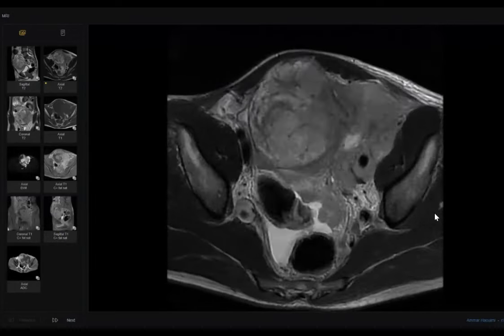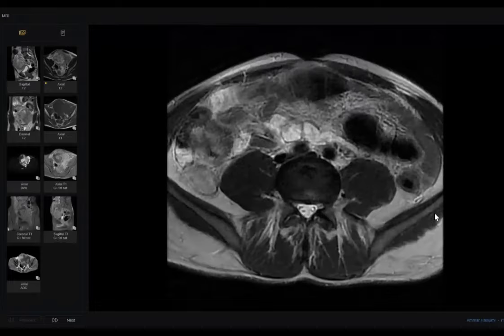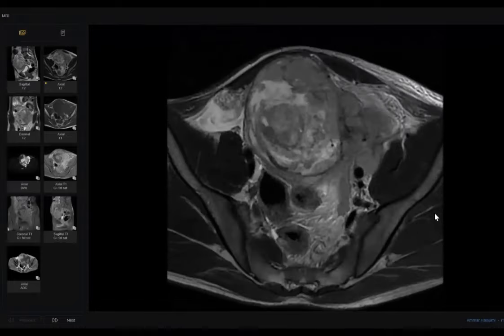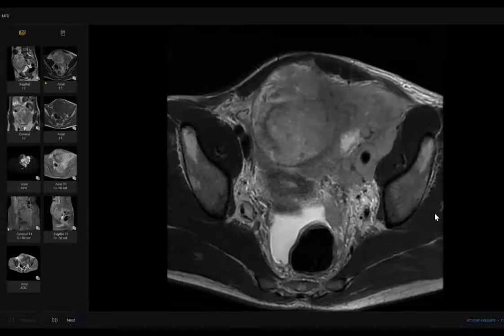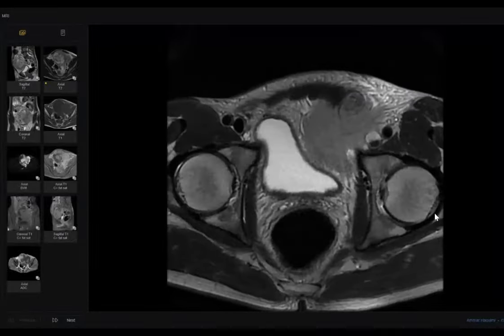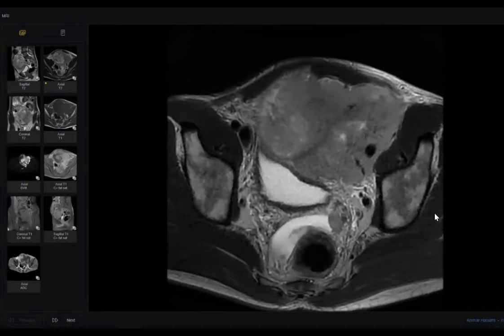What's your diagnosis? This appears as an aggressive mass lesion. I couldn't see the left testis, so this could be a tumor in an undescended left testis. Which type of tumor? If this is an undescended testis, this would be a seminoma.